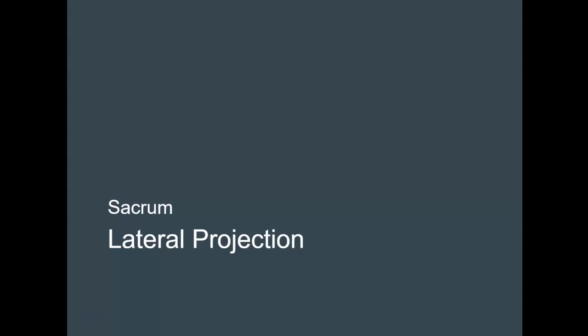To finish up our image analysis on sacrum and coccyx, this is part 2 of that. We're going to take a look at the lateral projection for both. Please understand that these image analysis guidelines are a little bit tailored towards performing the projections separate from each other.